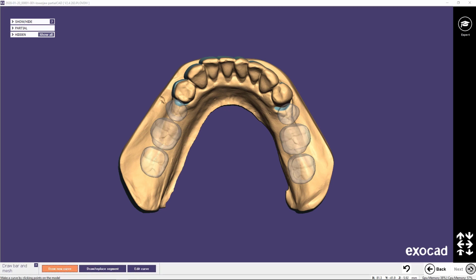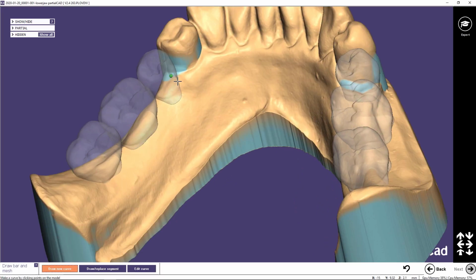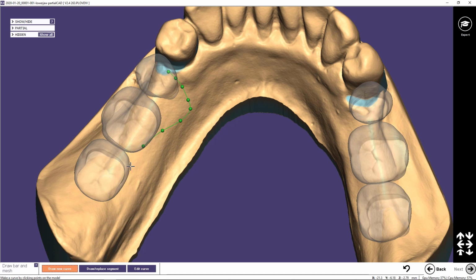In the next step, I can draw the outer outline of my retention meshes. In this specific case, I plan on designing more narrow fishbone-like structures, so I'm drawing a more narrow line. You will see why I do this later on when setting up the retention mesh directly in Wax.